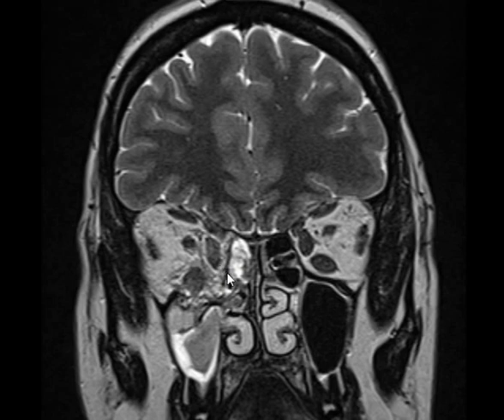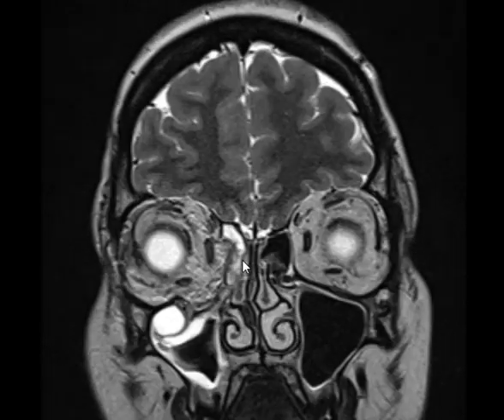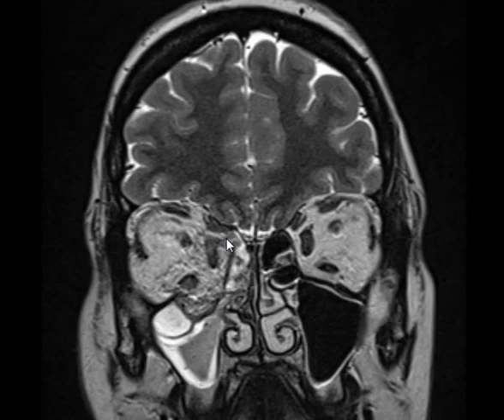Compare with this side, with this side. Intact. Okay. Let's look here. Yes. Herniating or not? Yes, herniation. Good. So we have herniation indicating fracture of where?